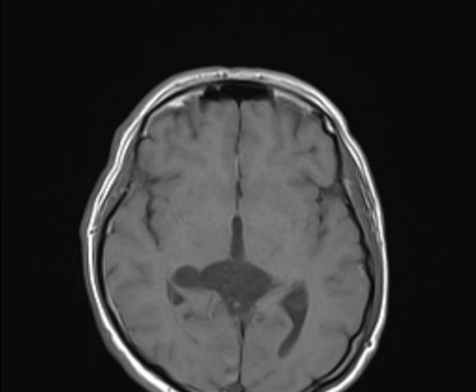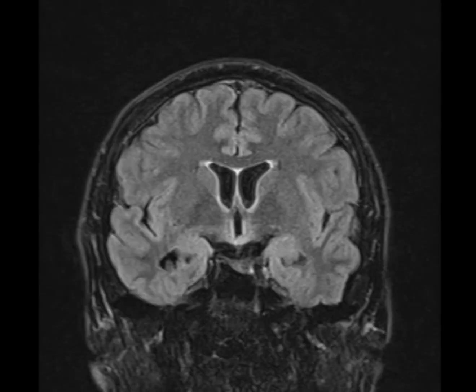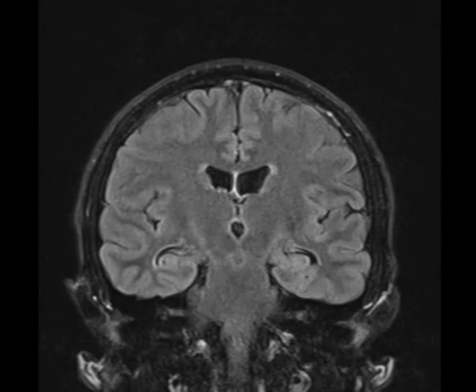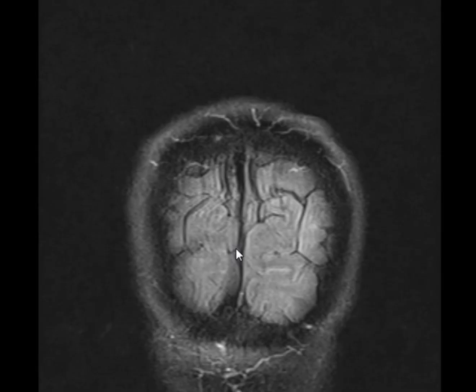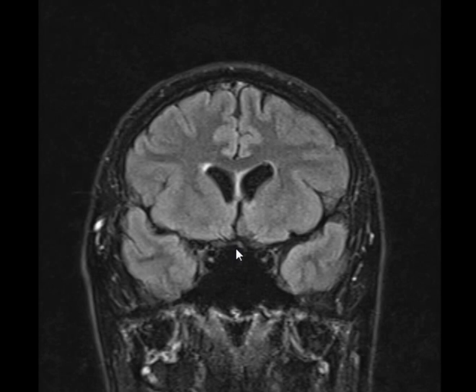So, how do we differentiate between all of these? First, we do a FLAIR to differentiate epidermoid from arachnoid. Yes. Please answer. See the FLAIR. What does epidermoid look like on FLAIR? On FLAIR it will be partial, not complete, suppression. Okay. But arachnoid will follow CSF with complete suppression. Let's see. This is the FLAIR. Partial or complete?